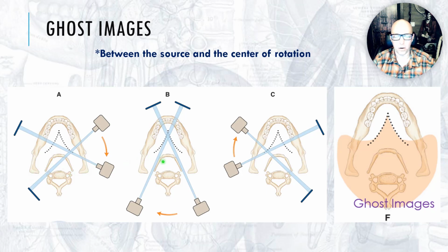Yeah, the spine and hyoid bone, most of the time ghost images are going to be blurred beyond recognition, so that's that white blur that you just see in a panoramic radiograph across the midline, and it affects the mandible mostly. And then over here, just the opposite. You get a ghost image of the left mandible projected onto the right side of the image. And so this orange just fills in everywhere in this patient where you might see a ghost image.